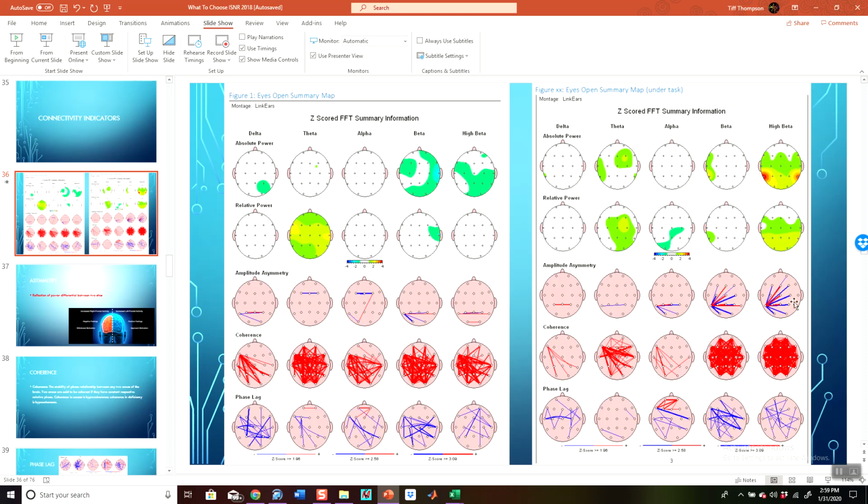So let's look at these 2 heads. What I'm saying is, this and this. What's that all about? Is that a bad thing? No. What that's telling us is what we can already see right here: that this spot is asymmetrical to the other sites in the brain. So asymmetries will largely reflect a deviance in symmetry that we can generally see in a power differential with our naked eye.